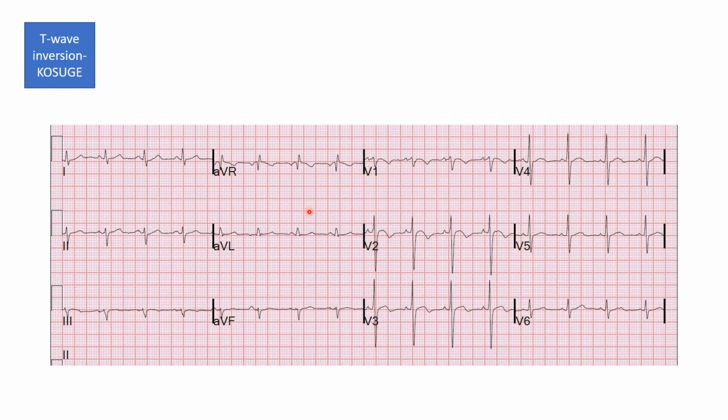Then you have T-wave inversion, which we also look for in the T waves. As I mentioned, if you have a T-wave inversion in V1 and in lead 3, then you have two territories. So if you have a patient with chest pain and you're wondering, is this ACS or is it PE, should we go to the cath lab or should we go to CT of the pulmonary arteries, then definitely it's highly specific in the Kosuge Japanese study from 2012, 2014, I think.